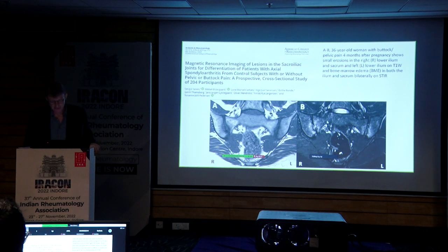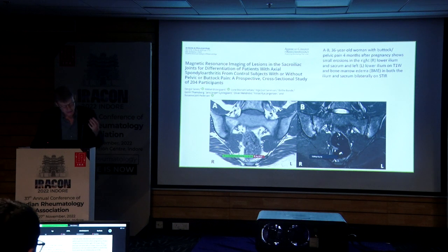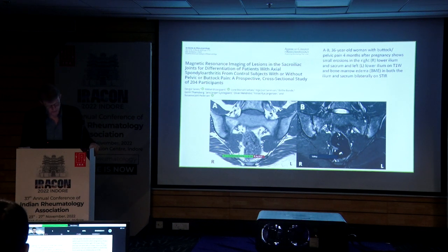This was a patient with post-pregnancy pain, and this was the worst case we saw. And that is pretty bad, because here you see it is in the anterior upper part, but not that much. And you see actually bone marrow edema, and there's actually also some erosion here and here. So we had one patient of this kind where I would say this definitely looks like axial SPA, but it wasn't. It was only 4 months after pregnancy.